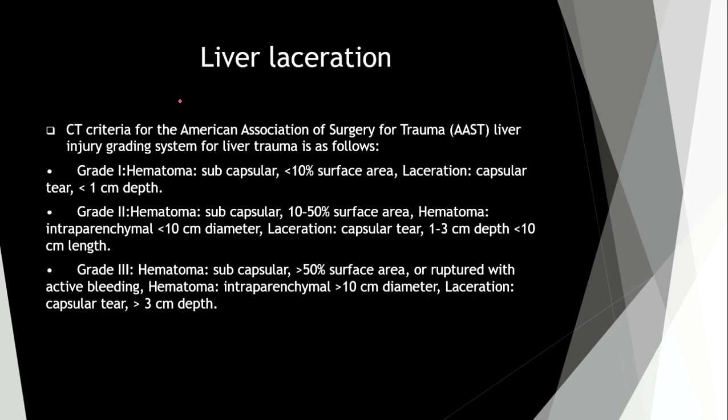Liver laceration. CT criteria for the American Association for the Surgery of Trauma liver injury grading system for liver trauma are as follows. I try to give you the emergency medicine situations. I didn't give you any oncology here because it would be too big a material for you.